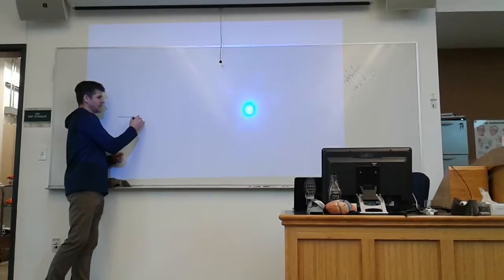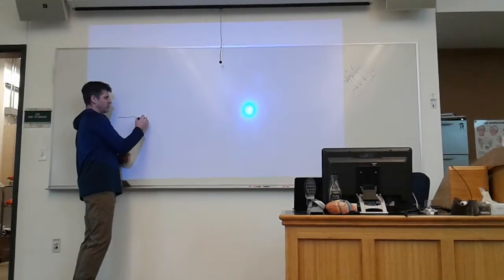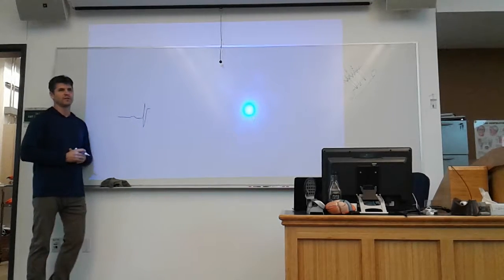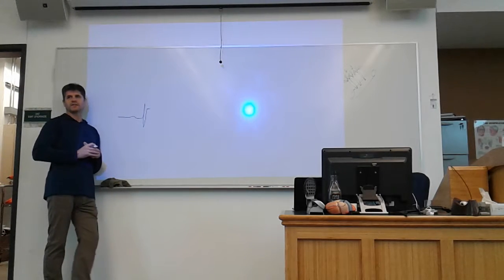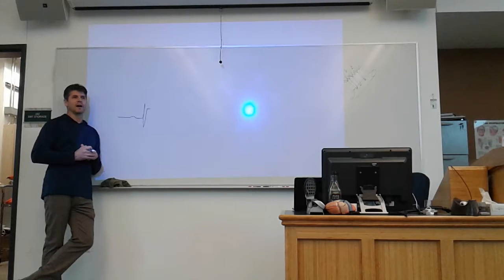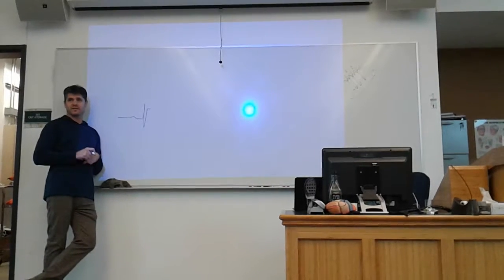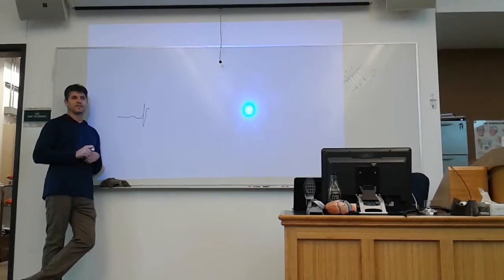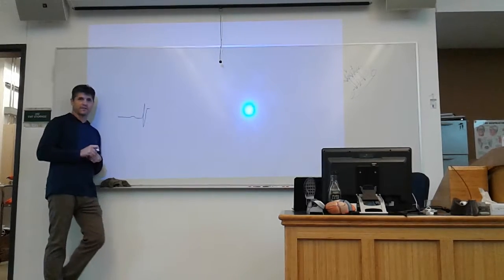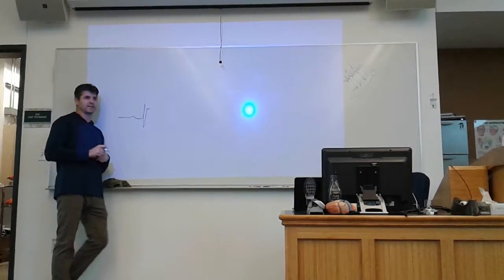And so once again, we don't see any problems in the depolarization stages, but we see a longer period of time of depolarization. So the ST segment stays above the baseline because those cells are more positive, because they're simply not repolarizing at all like they're supposed to. We might still have flipped T waves because the repolarization process, when it eventually does occur, is often occurring backwards, once again for the same reasons that we just discussed.